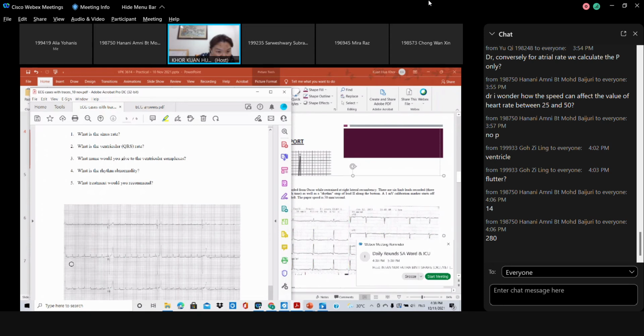Let's start with 2, 4, 6, 8, 10, 2, 4, 6, 8, 10, 2, 4, 6, 8, 10. Okay, 30 boxes. What is the sinus rate? How many sinus beats are there?